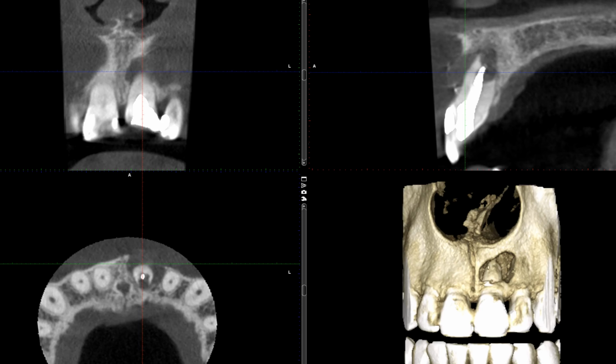Hi everyone, how are you? In this video, I would like to go over a case where a patient presents with a significant root resorption associated with endodontically treated tooth number 9. This is a referred case from outside, and I do not know the full medical and dental history of this area, but I'll be curious to know whether this patient sustained trauma in the anterior maxilla.